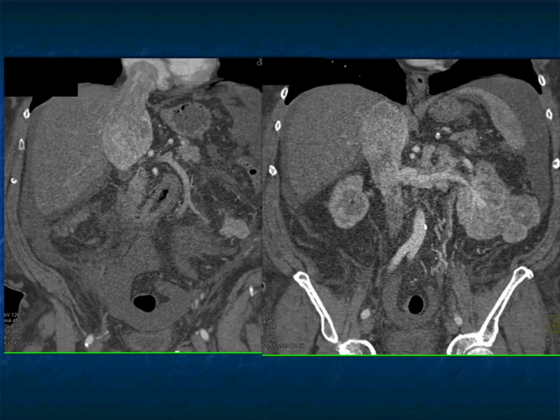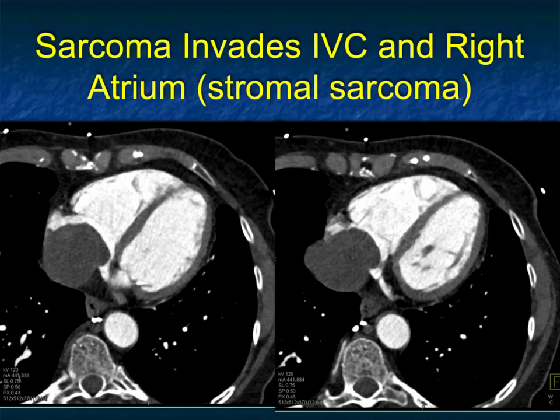You can see very nicely this patient had multifocal renal cell carcinoma. On the left side, you see the multiple masses, which grew into the renal vein, grew into the IVC, and into the heart. So again, if you see a mass in the patient's right atrium, you want to make sure you follow it downward. Don't start confusing a primary mass in the atrium, which is, in a sense, really tumor extension from beneath the diaphragm.